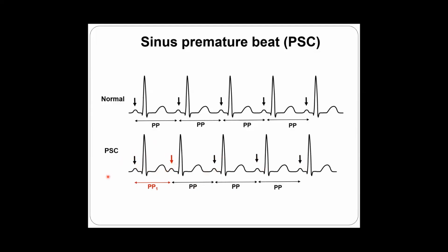That would be the difference when we have an atrial one. An atrial beat sometimes does not come from close to the sinus node, and this is why in any lead, maybe not in the same lead, lead number 2, but maybe in 3 or 1 or some other lead, you have a different P wave morphology. So the P is identical, and another very important thing is that the following beat, the compensatory pause or whatever, is exactly the same as a normal PP interval. So it means that the PP is always undercompensated.